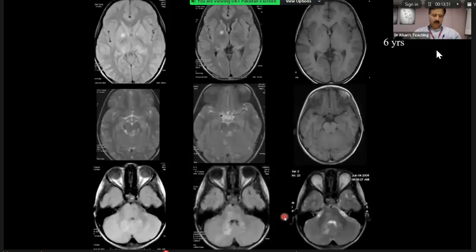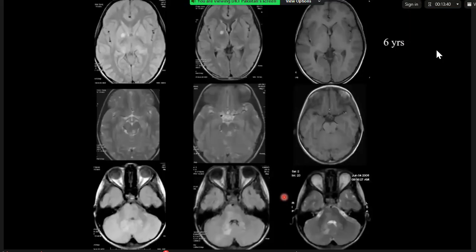Okay, right. Now, this is a very important concept, and this comes in the exam so often, and a few viva questions are for the exam in NF cases. What happens is that this finding is seen in many cases of NF, though it is not among the diagnostic criteria. Basically, what you see is high signal within various parts of the brain. Which parts? Anything.